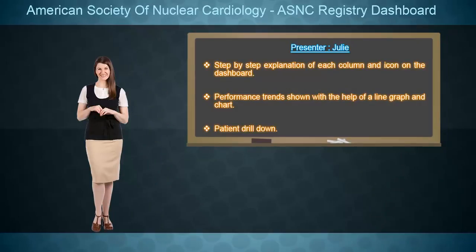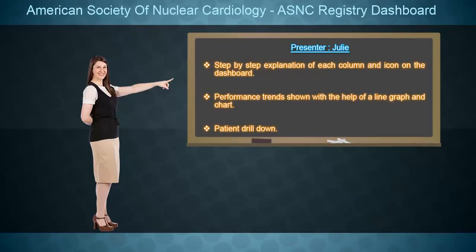Here we will be going over the following points. Step-by-step explanation of each column and icon on the dashboard. Performance trends shown with the help of a line graph and chart, and patient drill down.